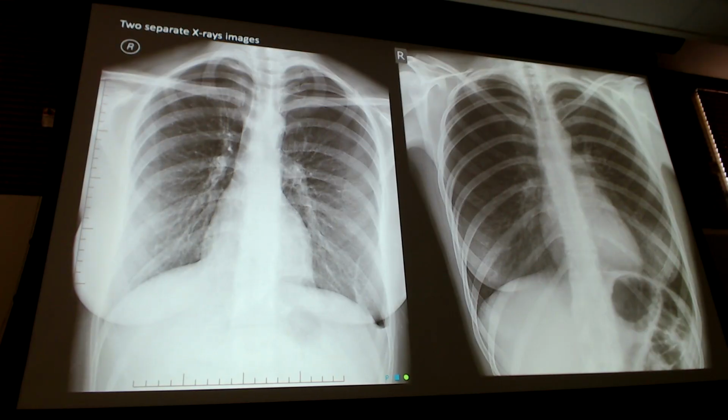Now, on the image on the right. Right here? Yeah. But what was the trauma, right? I don't know, was it a stab? What was going on? What caused what? But yes, there is trauma. For those that were looking at the rib fractures up here, that is the trauma. I would need to know, and I don't know with this picture, what the mechanism of injury was, to know if the pneumothorax was caused by a weapon in actual penetrating trauma, or was this blunt and maybe the rib punctured the lung, that kind of thing. I don't know that answer. But yes, that is the trauma.